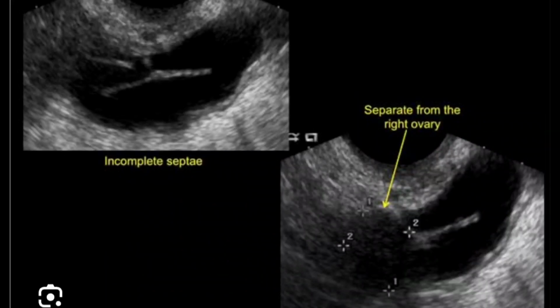So here on this image, this particular septa has been shown. This is a long and tubular structure which is likely a fluid filled fallopian tube, distended fluid filled fallopian tube with incomplete septa.